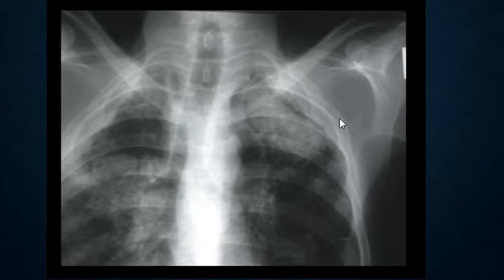Another example, if it was in a TB cavity, most of the time it will be in the upper lobe. In our part of the world, as we said, in the Middle East, usually it is TB, okay? So TB usually cavitates in the upper part of the lung. So when you see it, think more of the upper part rather than other places of the lung, okay?